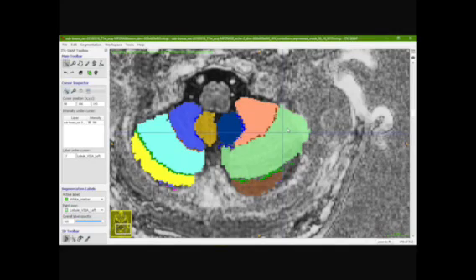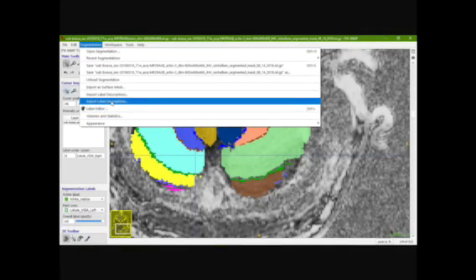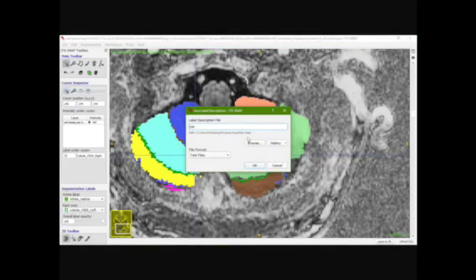And that is also going to take you to the region in the horizontal view that you're looking for. Now that we have created two different labels, if we wanted to save these labels, what we are going to do is export the labels. So in this case, because we are saving the labels that were created in a mask, we have to export them. So we just click on export label descriptions, and then give a title. So I'm just going to type new labels, and then you just click on OK.